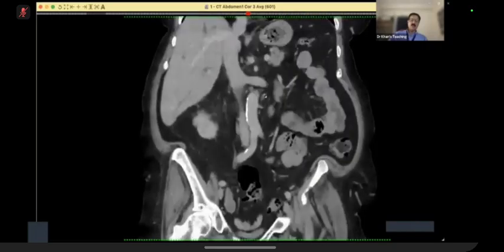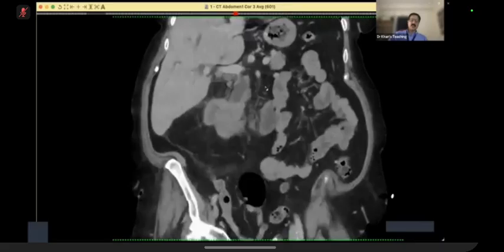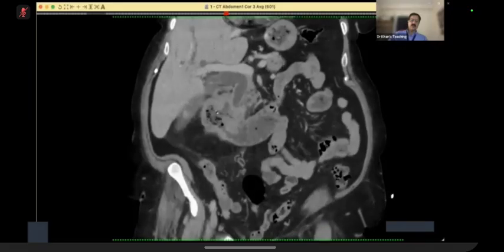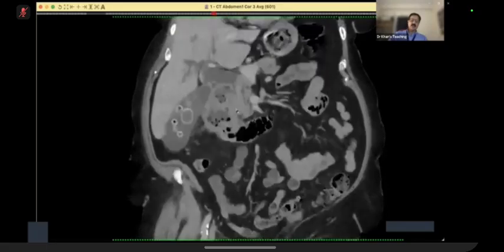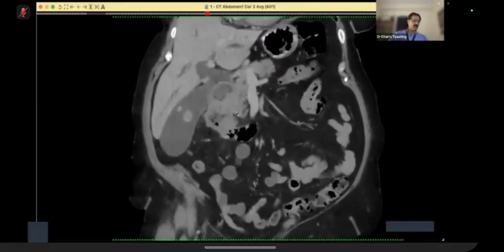I did not show you a coronal CT, I mean to say, but you can see the same things which we picked up on that MR: this is the D3, this is the tumor, and this is the CBD, which is obstructed here. So this was a simple case where the fine touch is what is the epicenter, and in this case we can actually pinpoint the epicenter. So candidate 2, thank you very much.